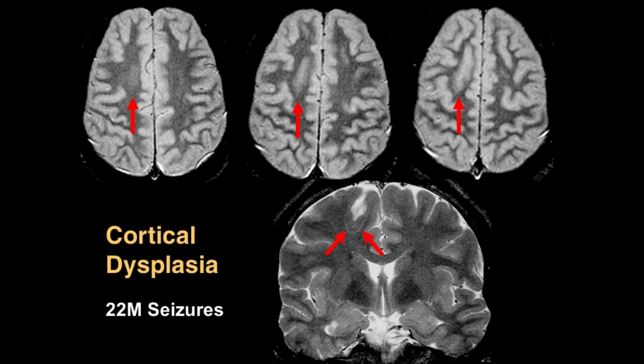This sort of cortical dysplasia can cause focal seizures, developmental delay, and the other side of the coin is if that's in a safe area to remove, we can treat these children surgically and prevent a developmental delay and allow them to achieve their milestones just as any other child. So subtle, yes, for sure, but very important to be able to pick up this sort of finding. You may be aided by additional information about frontal lobe seizures with, for example, fencer's postures, or you may know that the EEG has frontal spikes and that'll help you, but this is a finding we should be able to make, this smudgy gray-white junction.